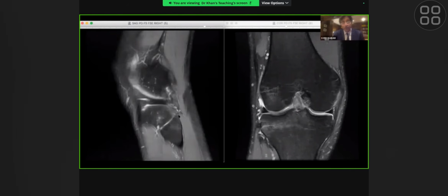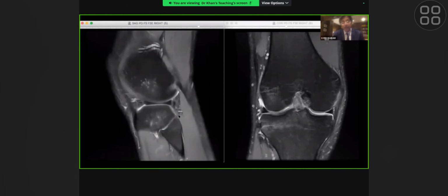As I move centrally, I immediately look at the femoral condyle and the posterolateral tibia. At this point, this is the most important finding. Even without doing anything, I can tell you now that this patient has a complete ACL tear. Why? Because of the contusion pattern. Look at the bone marrow edema of the lateral femoral condyle and the posterolateral tibial corner, and perhaps subtle marrow edema of the fibular head.